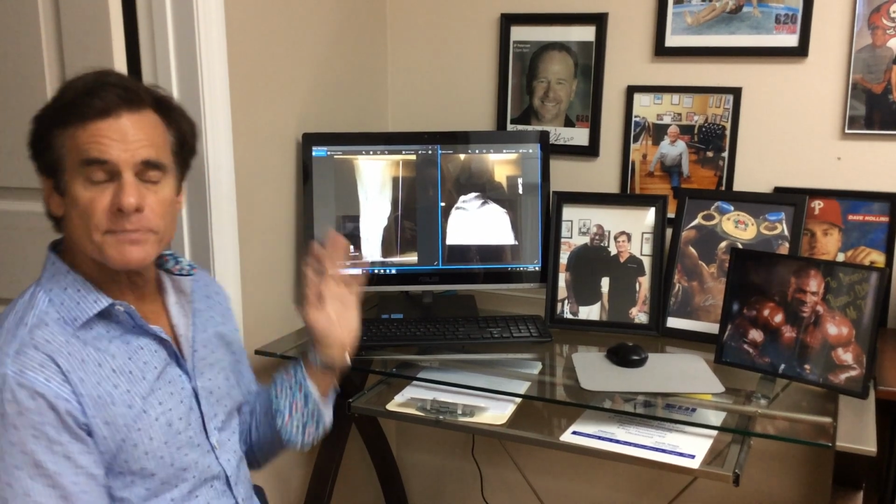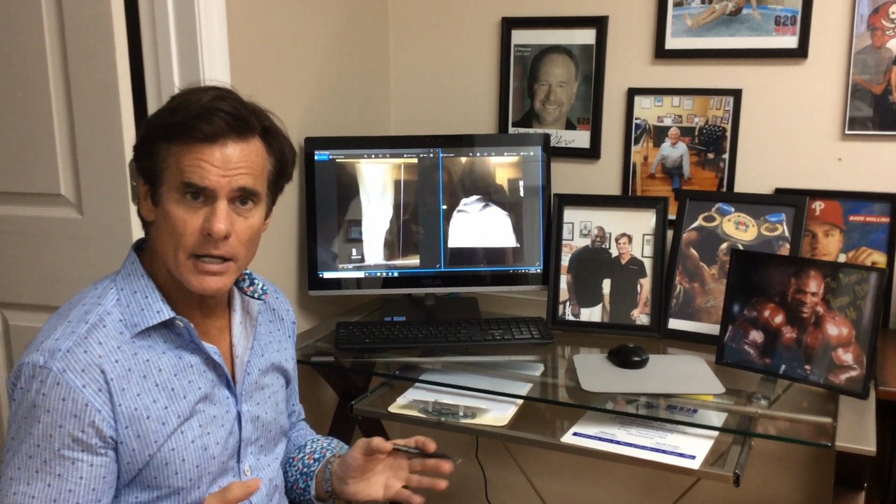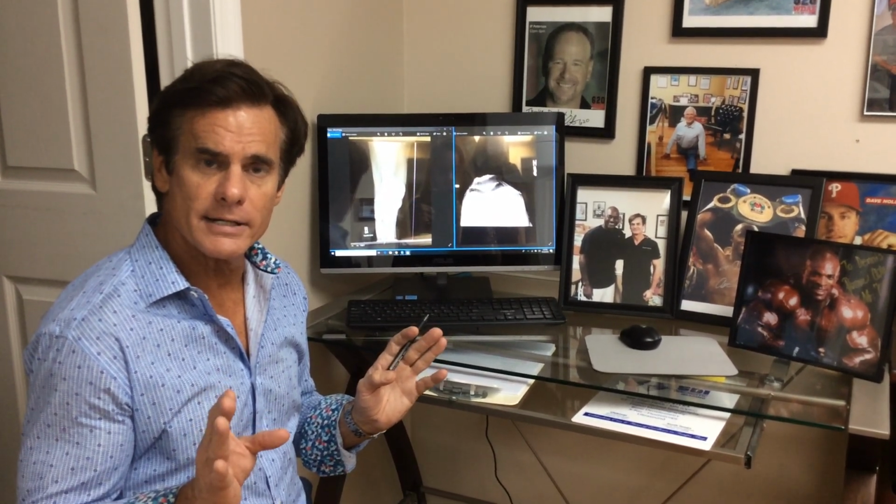And this gentleman has become wheelchair bound in the last year. He's progressively lost his ability to walk, and so now he not only has pain, but he's severely debilitated. So we're going to look at his 2018 X-rays now.